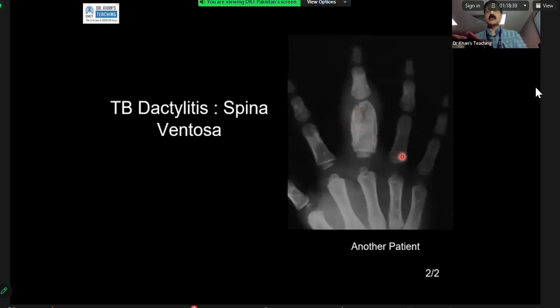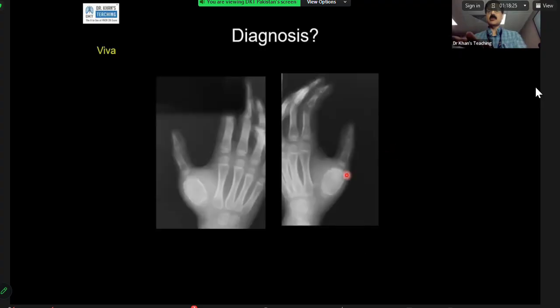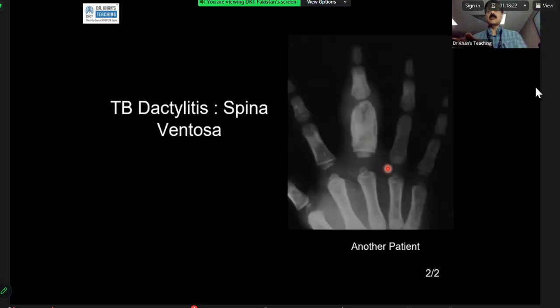By the way, syphilitic dactylitis is a differential, though I did say that this is an aunt minnie because of the expansion of the medullary cavity. Enchondroma will be a lucent lytic lesion. This is not a lucent lytic lesion. Second thing is that in syphilitic dactylitis, there can be thickening of the phalanx or the metacarpal, but that is because of cortical thickening and periosteal reaction. So expansion of the medullary cavity, just remember that.